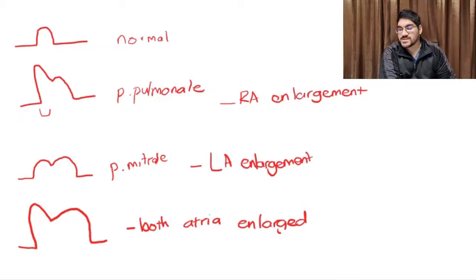But here in this one, you've got an abnormal right atrium and an abnormal left atrium. Right? And these are the typical things that you'll see from a P-wave generated by the SA node, if it's normal or it's abnormal. If you see a different morphology that doesn't look like this, it's likely that the SA node is not the one generating that P-wave.